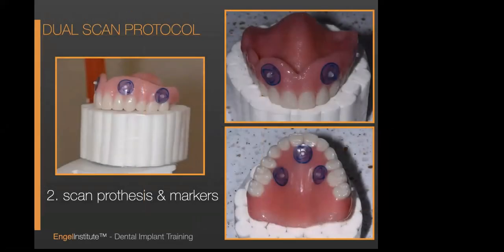Here is, I apologize, it kind of went backwards a little bit, but here is what I do with the denture scan. This should be your first scan, not your second scan. We want to put this on something that is radiolucent, thus the cotton rolls. The reason being is that if you set the denture on the bite tray or the chin tray, anything that has metallic in it, that white tray that you see, or the chin rest, they will not be able to see the edges of the teeth clearly.